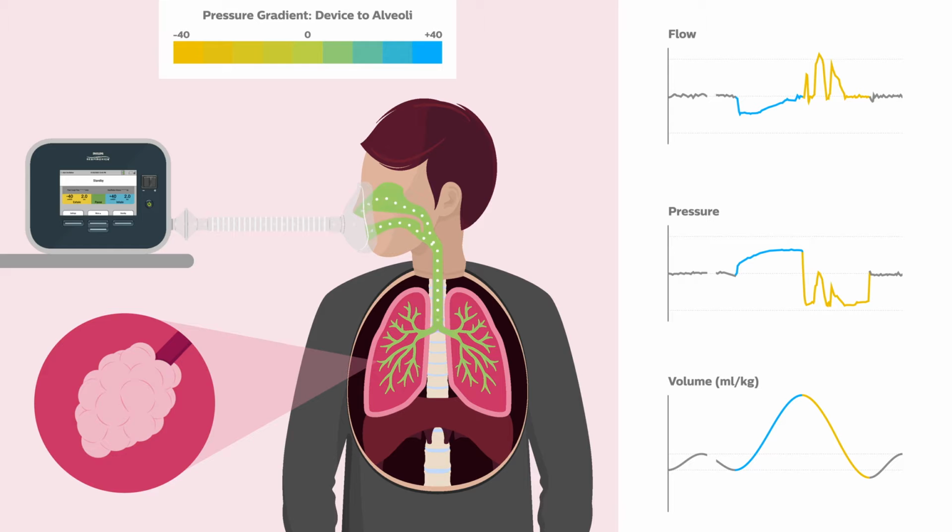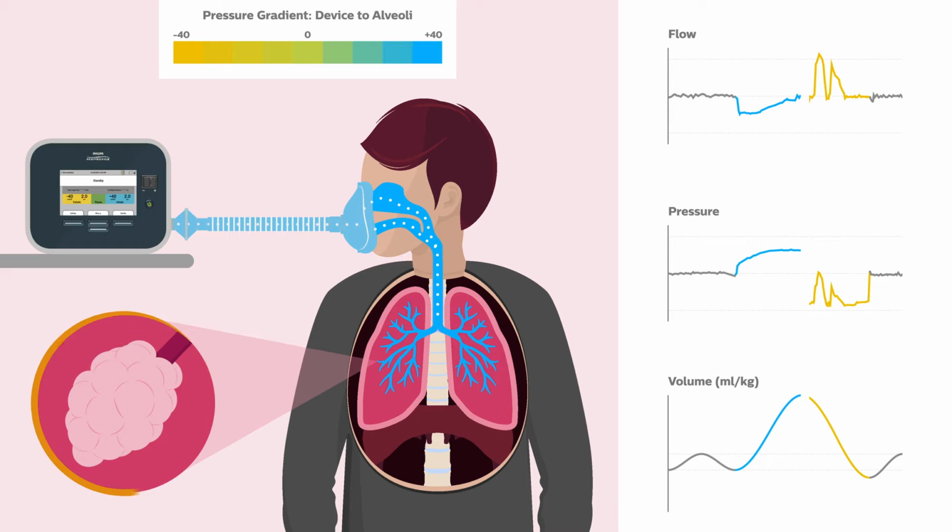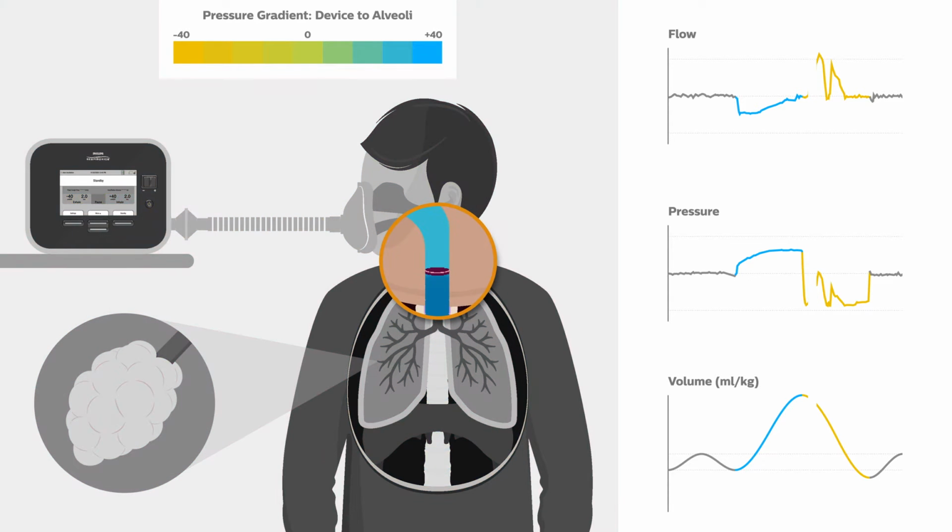These are the key takeaways from our first model. First, an appropriate target inhale pressure and time setting allow the alveoli to fully pressurize so that our subject is at or near maximum inspiratory capacity. The combination of glottic closure and active compression increases alveolar pressure due to the inverse relationship between volume and pressure.